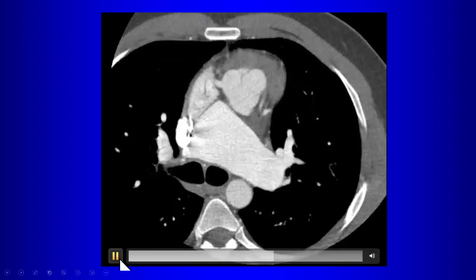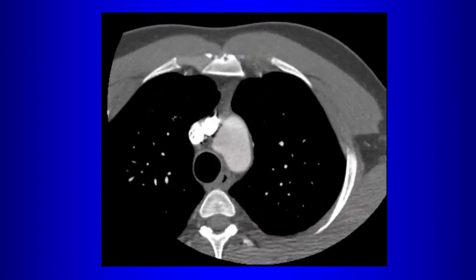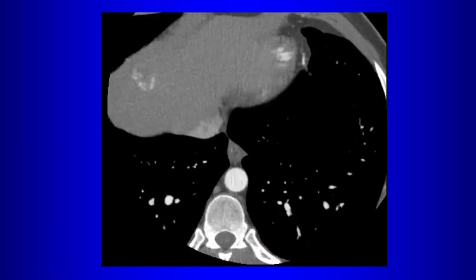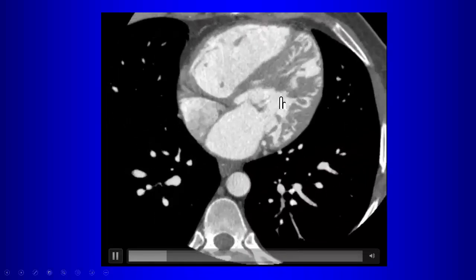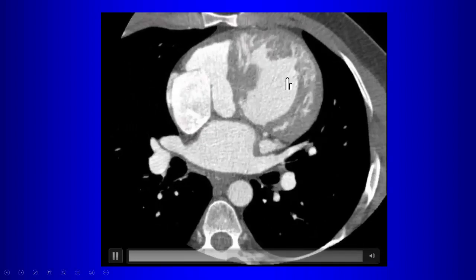The aorta is coming from the left ventricle. Well, what's the morphology of that ventricle? What is that structure going across? That's a moderator band. But this ventricle is also increased in trabeculation, right? So what's the morphology of that ventricle? That's a morphologic right ventricle. So this would be a morphologic left ventricle. That morphologic right ventricle is connected to what structure?